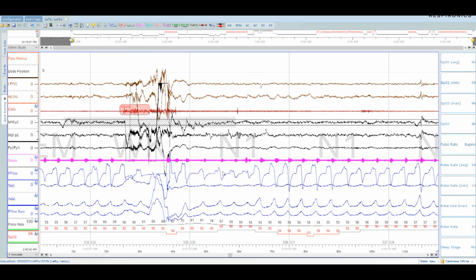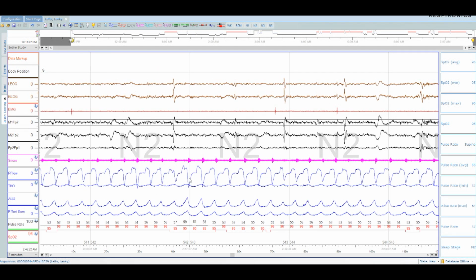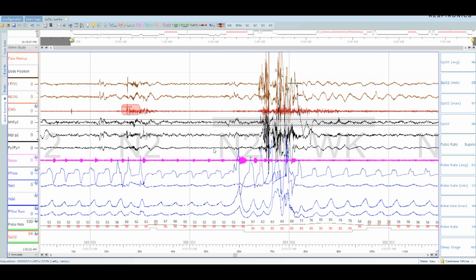And we have an arousal. There's a lot of arousals here, my God. I feel like I should be sleeping better with my career choice. What is happening here? I guess it's like a mechanic whose car is trash. Maybe. I want to call that. I'm just going to acknowledge the arousal.